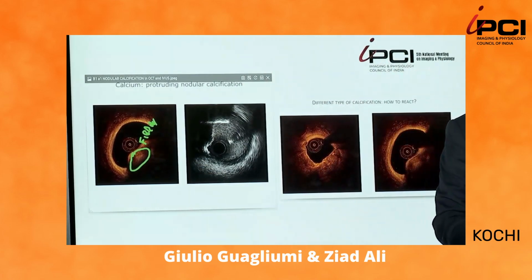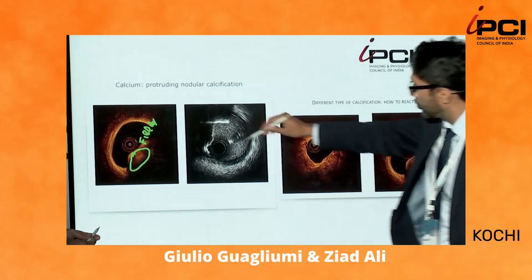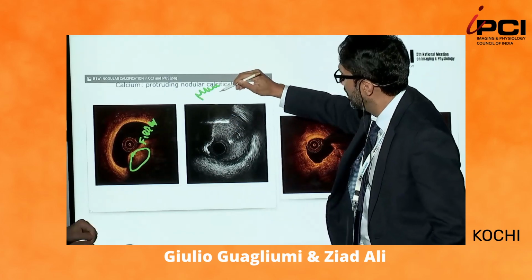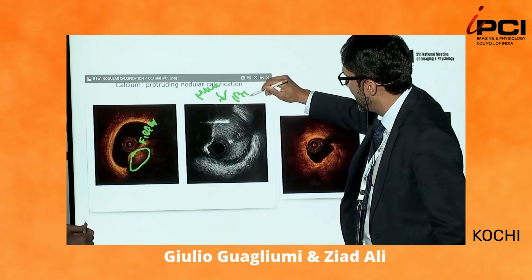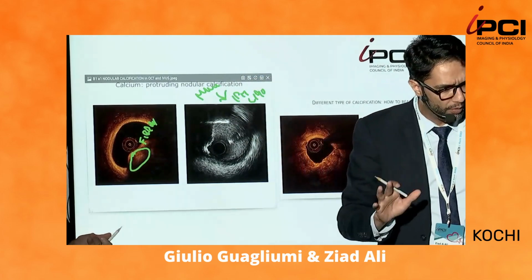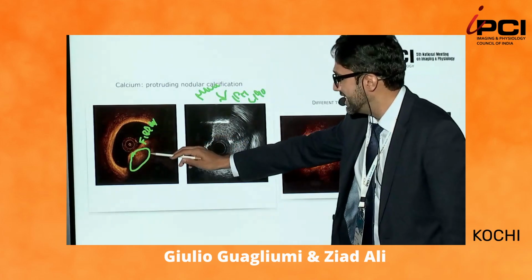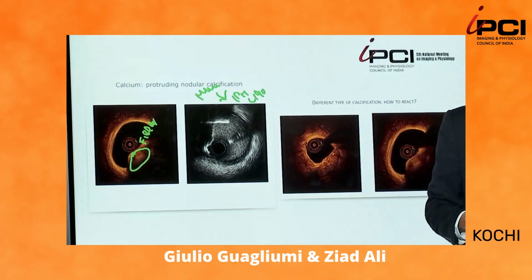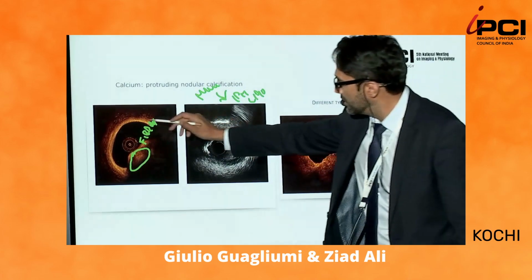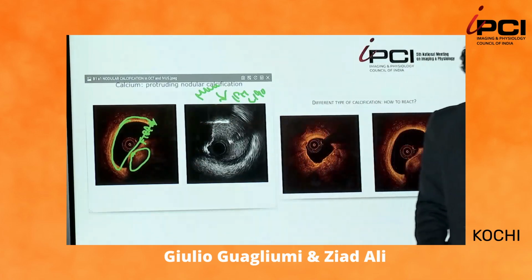It's a marble. Okay? Can you crack a marble? No. You can only push a marble. And so the treatment of the eruptive calcific nodule, which has intraplaque hemorrhage and lipid underneath it, means it's almost always deformable. A balloon pushes that out of the way, a stent pushes that out of the way. But this is not deformable because it's a marble. And this is what frequently will lead to an eccentric stent expansion and asymmetry.